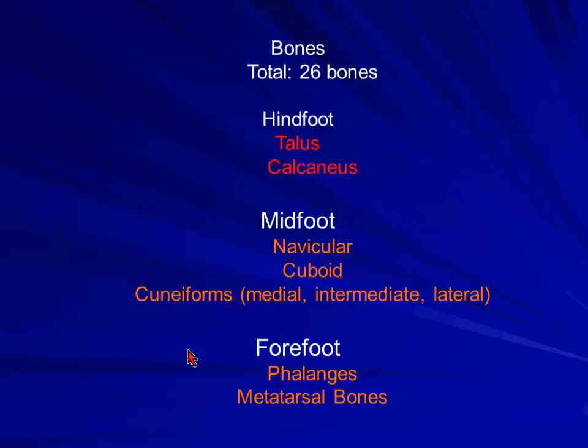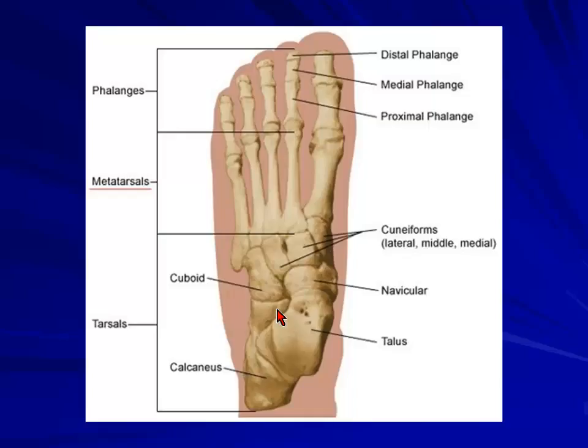So joints forming from here. So this is the talus, that's the calcaneus. So the calcaneus articulating with the cuboid, CC, the talus articulating with the navicular. You can see the different morphology of these two bones, cuboid and navicular. I get confused most of the time when I'm looking at the SPECT CT. So I need to adjust my brain, what is the medial and what's the lateral.